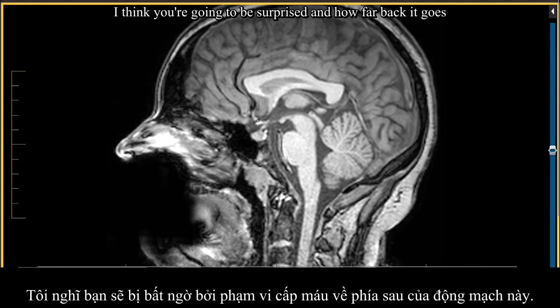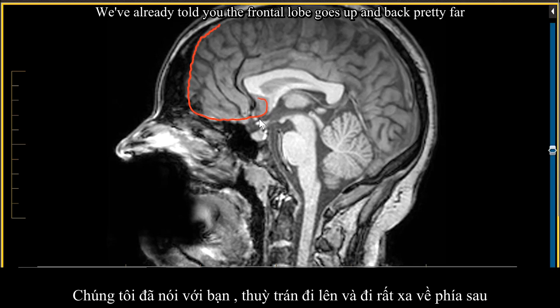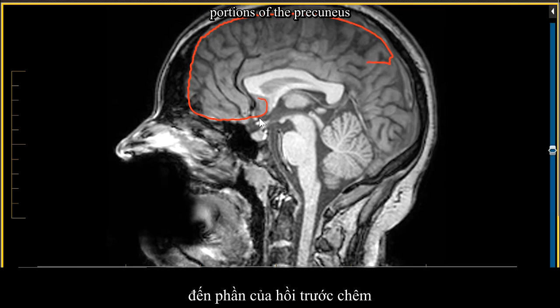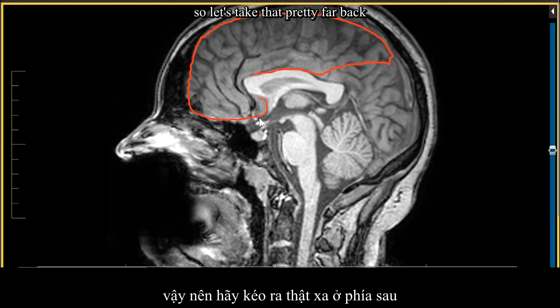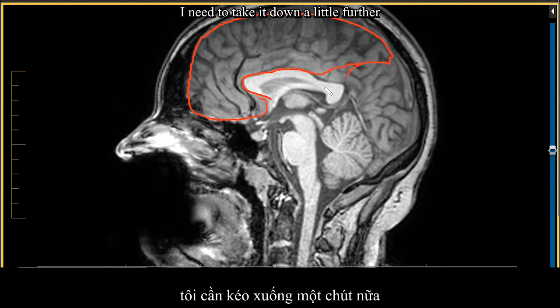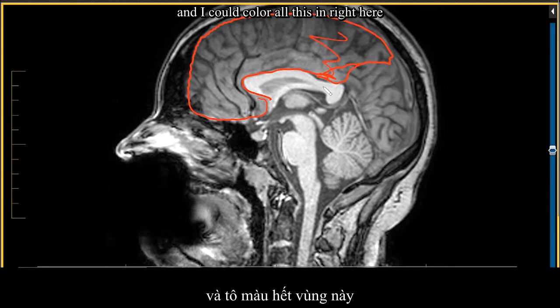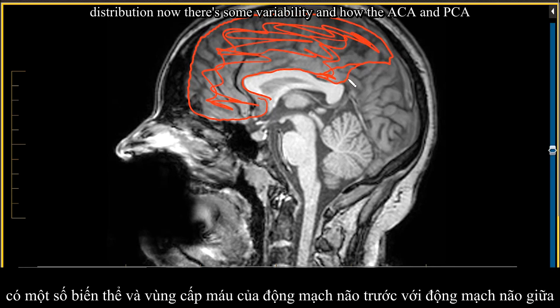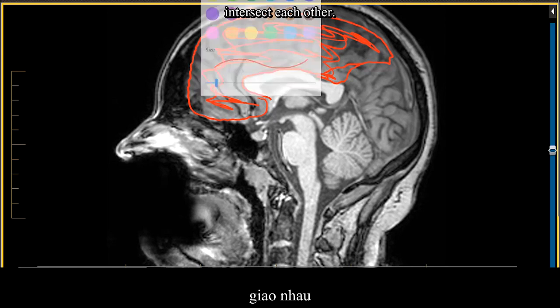I think you're going to be surprised at how far back it goes. We've already told you the frontal lobe goes up and back pretty far, but the anterior cerebral artery will encompass portions of the precuneus. So let's take that pretty far back, and then I need to take it down a little further, and I could color all this in right here, and this would be anterior cerebral artery distribution. Now, there's some variability in how the ACA and PCA intersect each other.